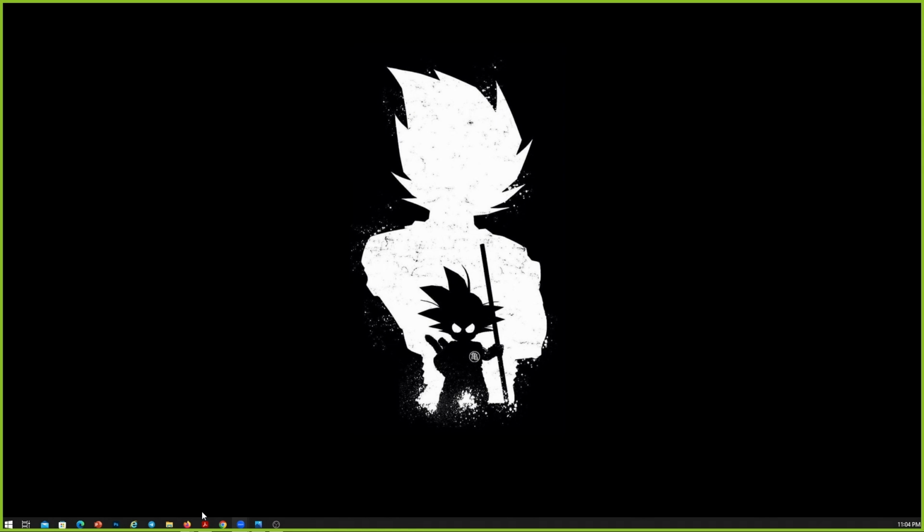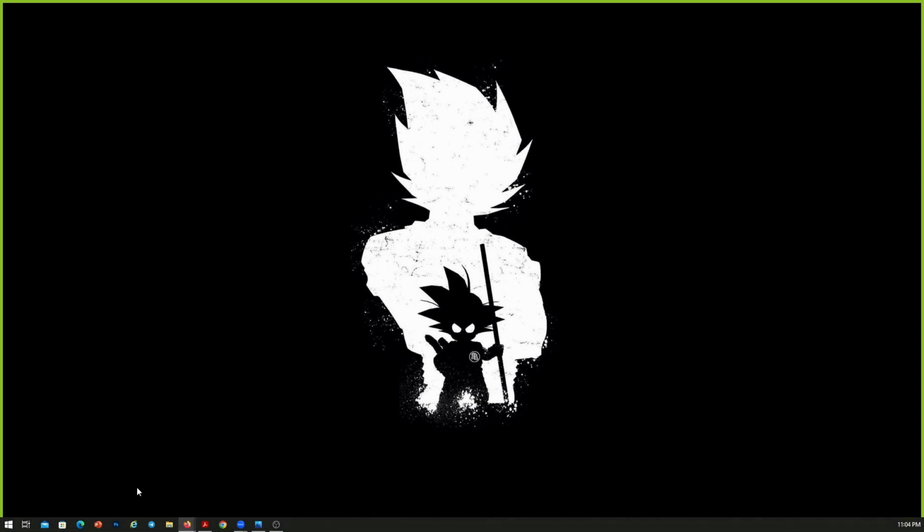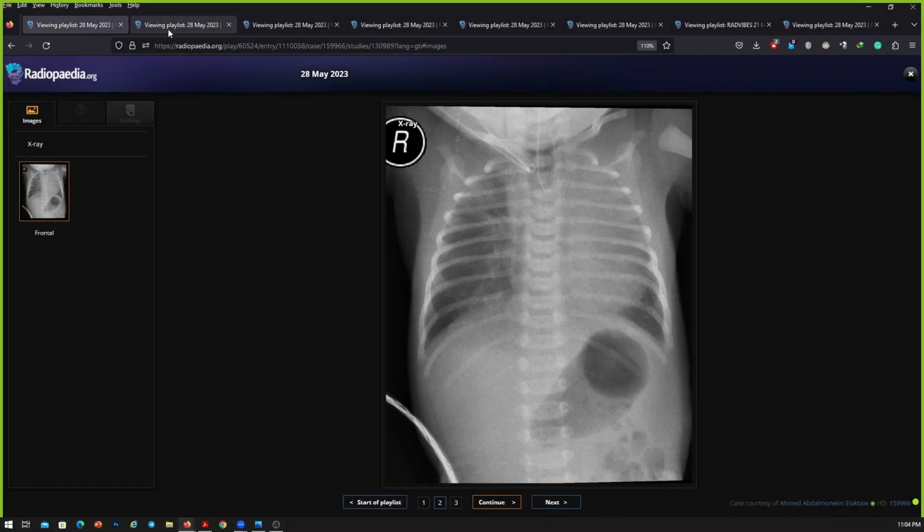So here we go. And candidate 1, are you ready? Yes, sir. So I'll be taking the first Viva for you, and then candidate 2 and 3 will be conducted by Dr. Smita. So you may begin. This is your first case. I hope you can see the screen, and there's a chest X-ray of a pediatric patient. Yes, sir, I can. You can go ahead.